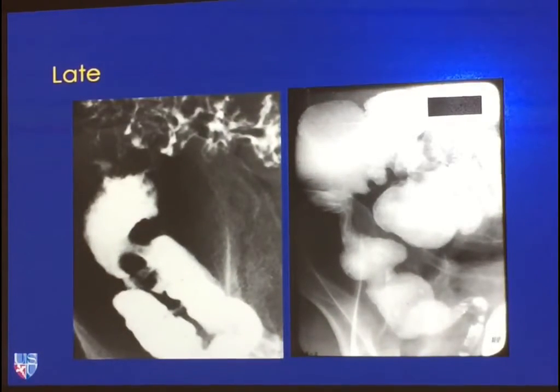Now, we've made it through our acute stage, now we're in chronic disease. Again, scarring and fibrosis is really what can give it away. So this is, I think, a very nice example of a cone cecum forming a point here. And here's an example of a colonic stricture. This area never opens up with time. This is a scarred down, strictured colon.